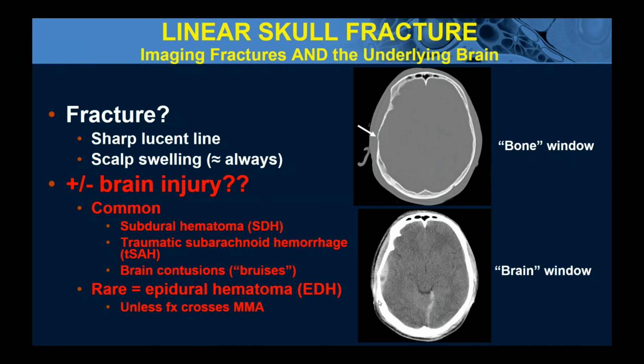So here's a fracture. We can see the scalp swelling that overlies it, which is a good sign that you look at to see if you think a lucent line that you see on the skull CT scan is a fracture, or is it just like a suture line.